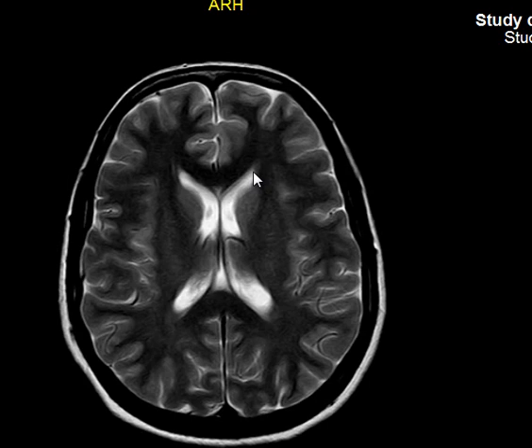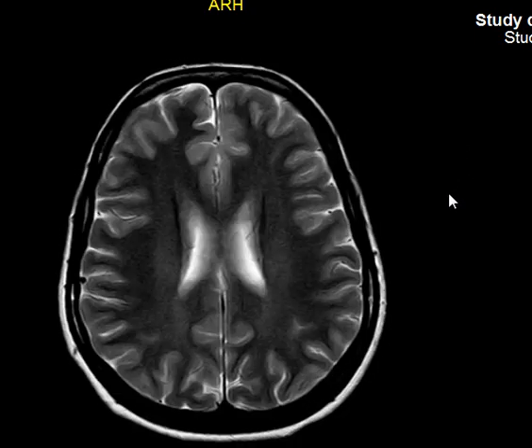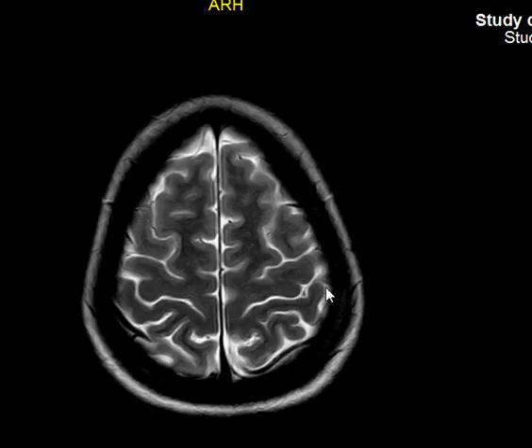For example, dogs, they have a big olfactory area. They smell well, but their frontal lobe is smaller. You know, it's like a function. So, again, when you have this central sulcus, everything anterior to it is the frontal lobe, posterior to it is the parietal lobe. Okay?